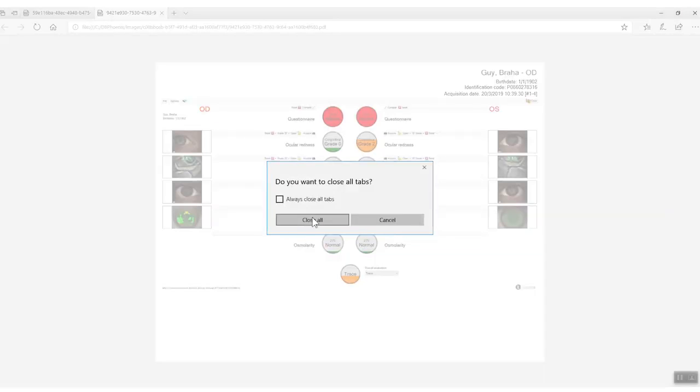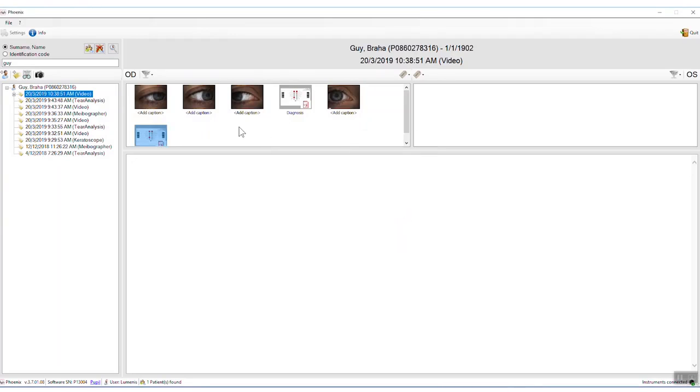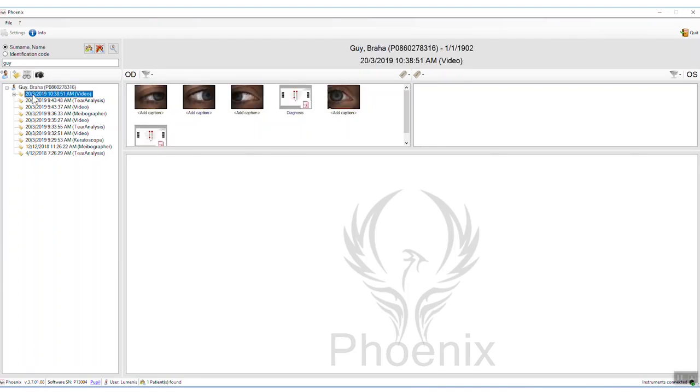So that will allow us to actually keep a tab on the patient digitally without having to only have it on a print. So we can print it or we can digitally save it in the folder as an archived report. So that works pretty well, and it will always be under the patient's last folder that was opened up for him. So we will be able to have this diagnosis available to us in the future. So we can save it and we can print it.